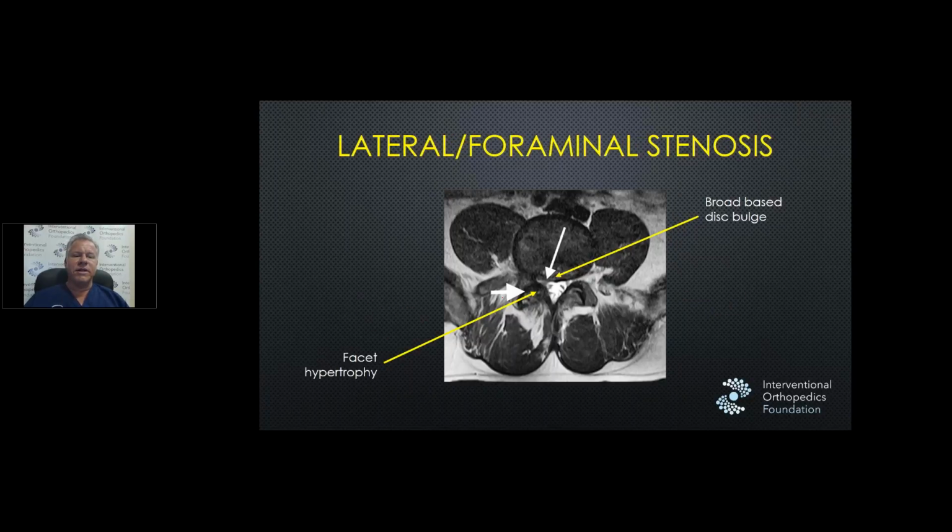Lateral or foraminal stenosis, usually due to, again, facet hypertrophy and a disc causing some focal decrease in the hole, or the foramen where the nerve exits.